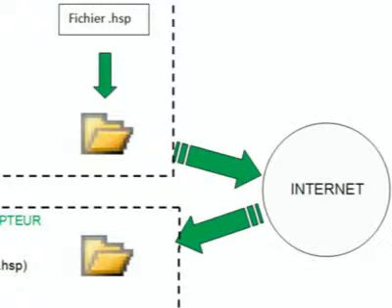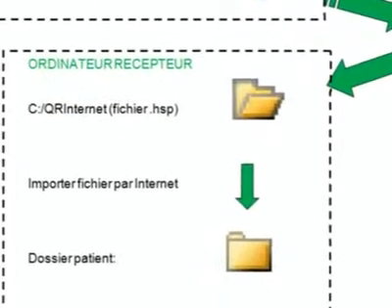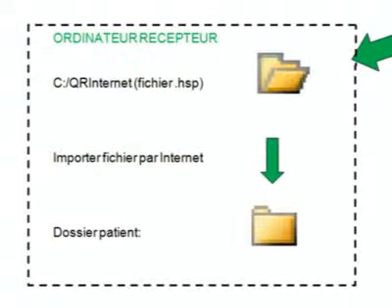You may also record the file on a DVD or on a USB key. The reading of an Internet file is simply to retrieve the file from a subdirectory and decompress it in a current directory with the command Import Internet File.